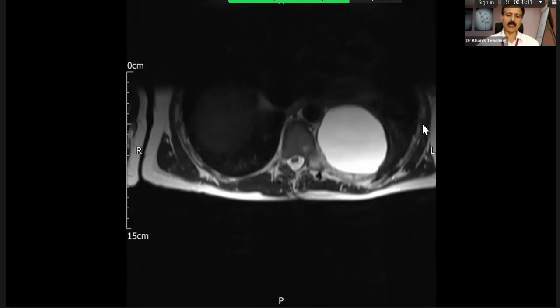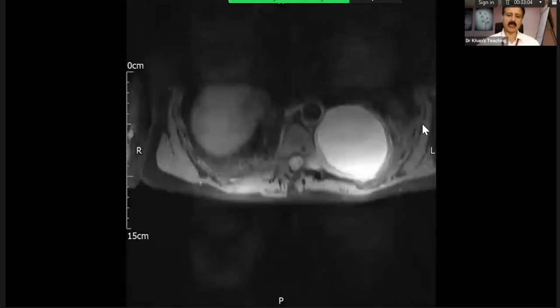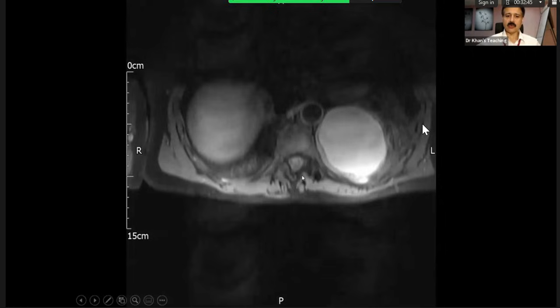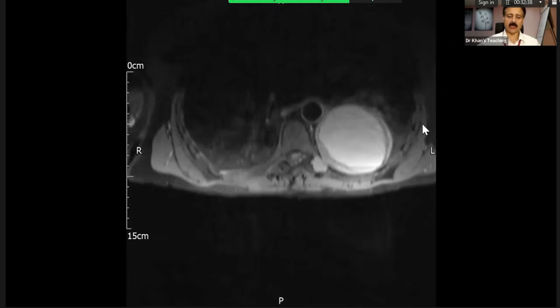So another point here will be that on T1 pre-contrast fat saturated sequence, the physics is slightly different and everything becomes slightly higher signal than normal. And at times you will make a fool out of yourself, particularly in the spine, where it will appear very high signal. And actually that is normal. It's normal physics. So develop your eyes on a T1 fat saturated pre-contrast.